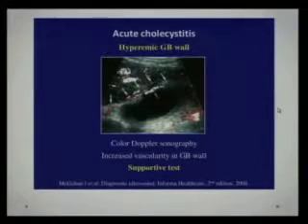Hyperemia of the gallbladder wall can be seen on color Doppler or better seen on power Doppler. It's increased gallbladder vascularity, and it is a supportive test. It's not a diagnostic test.